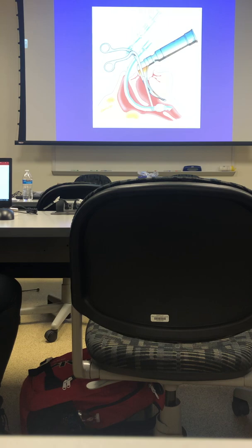Okay, so here's your trachea. See how anterior it can be? So when you put the patient in the sniffing position, it kind of opens it more in a direct path for you to put a tube in. Here is your esophagus. So you want to make sure you're getting it through the cords into the trachea, okay?